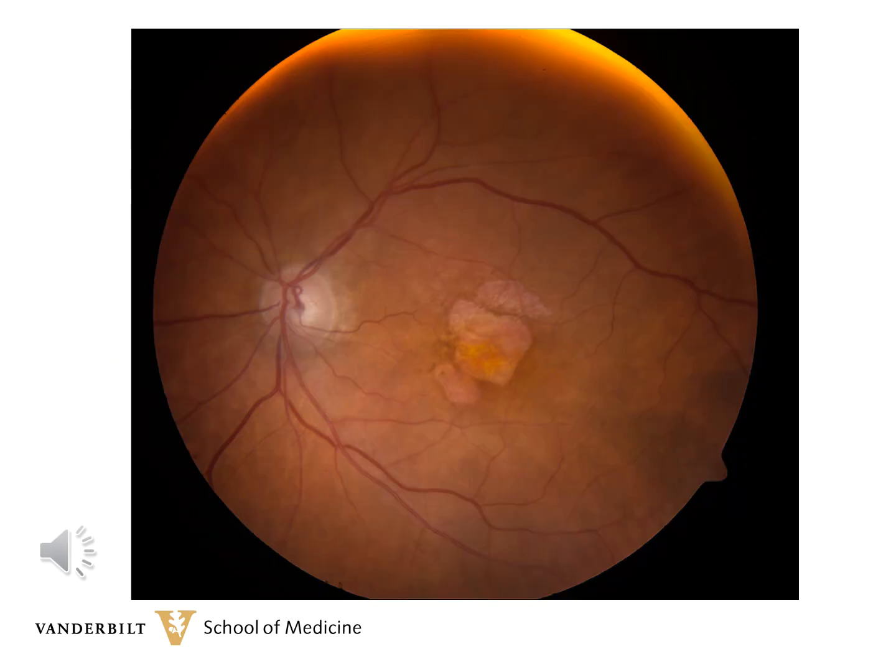The patient was started on monthly anti-VEGF treatments, and several years after the first diagnosis, the PED has flattened. He's able to retain his vision at about 20/80 because the atrophy is just temporal to the fovea, and the fovea is yet uninvolved with the area of atrophy. The pigment is down, and there's no hemorrhaging at this time, and he's maintained the vision for many years with regular injections.